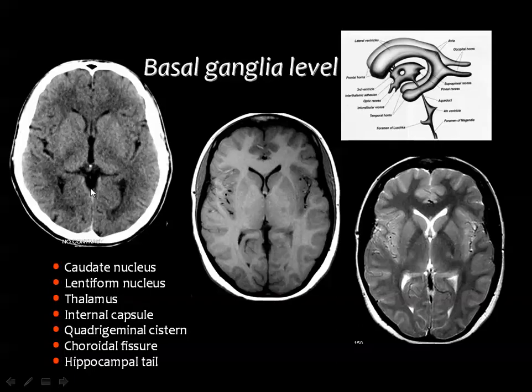And this area is above the cerebellum, so it is known as the superior cerebellar cistern. Then the anterior corner is just a CSF recess passing above the third ventricle. It is known as the velum interpositum. I will talk about this velum interpositum later on.